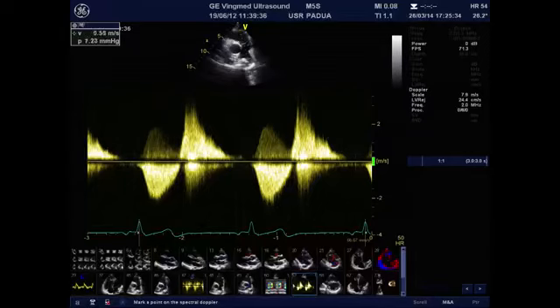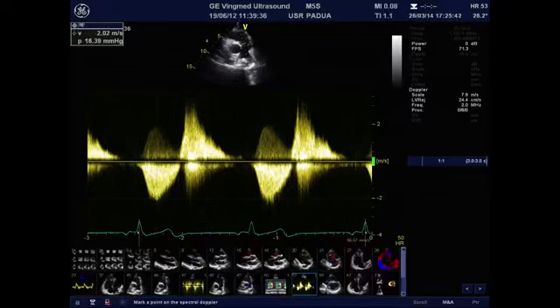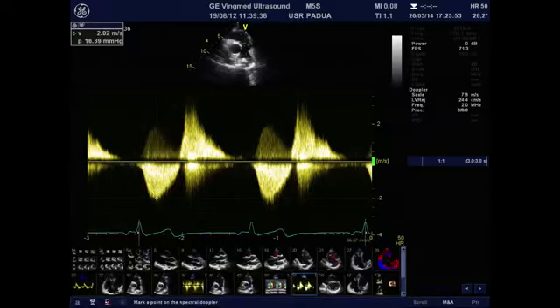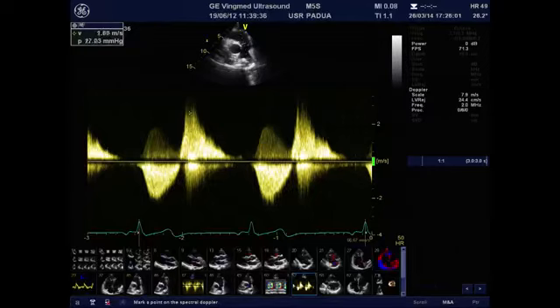Here you have the anterograde flow, which measures, in this case, 2 meters per second, which is reflective of a high antegrade volume that is the consequence of this significant pulmonary regurgitation, and it's not indicative of fixed stenosis, but is a relative stenosis. And in diastole, you will see the envelope, the signal, which is intense and has a steep deceleration in diastole, which reaches 0 before the end of diastole.